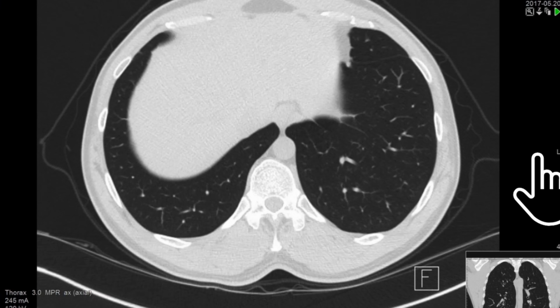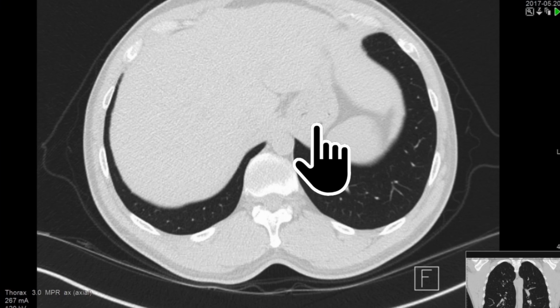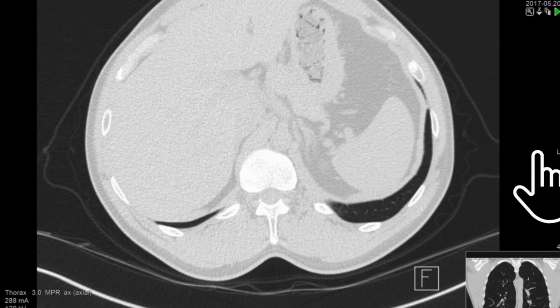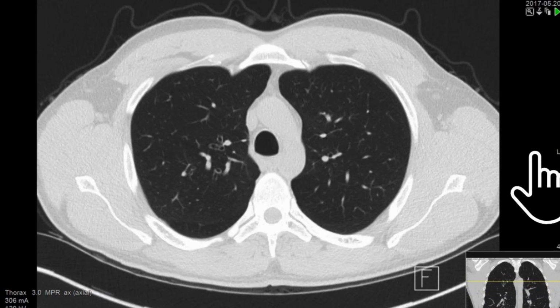We're coming up on the diaphragm. And as we go through the diaphragm, look, the esophagus is moving over here. Now we're getting into the air spaces of the stomach. So we can see the esophagus too, we can recognise the esophagus. Right, scroll back up to the top.